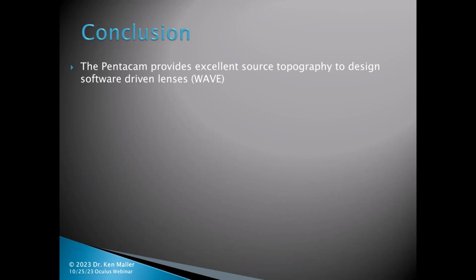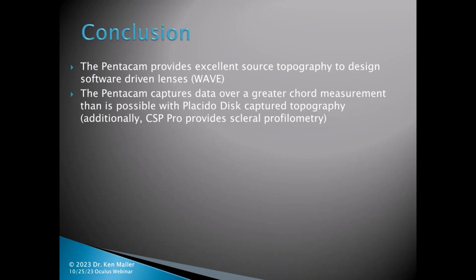So in conclusion, we have the Pentacam, and it provides excellent source topography to design software-driven lenses. In this particular case, I used Wave, but it is compatible with some other software platforms. The Pentacam captures that data over a much greater chord than is possible with Placido disc. And additionally, the CSP Pro allows you to really get out for all the scleral profilometry. On the CSP Pro, 18 millimeters is actually fairly simple to get covered.